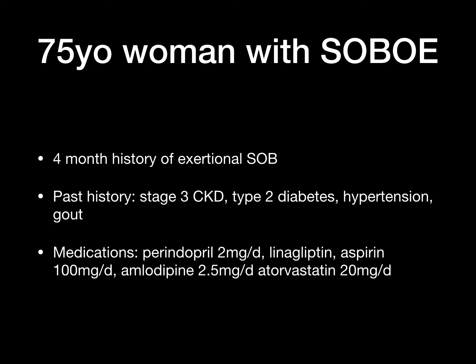So same ECG, but now presenting with shortness of breath in a patient who's really multimorbid in terms of their diseases. So just looking at the risk factors, kidney disease, hypertension and diabetes, the probability of underlying heart disease, either heart failure or ischemic heart disease, is high. Now this lady also has symptoms. She's breathless on exertion.